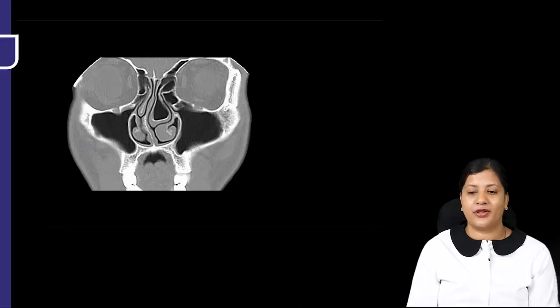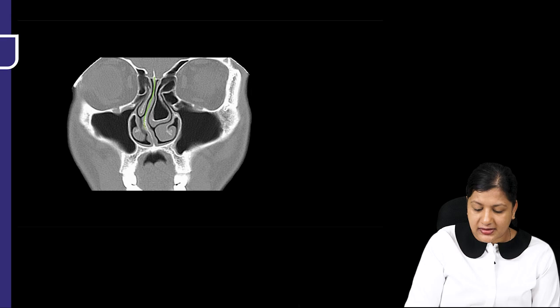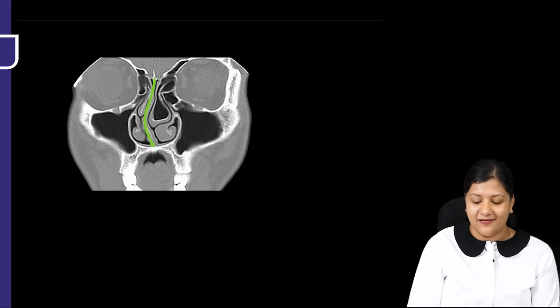Let us go and see some pathologies also. So if we see the scan, we see this is our nasal septum. So this is the nasal septum. We see this is your inferior turbinate.